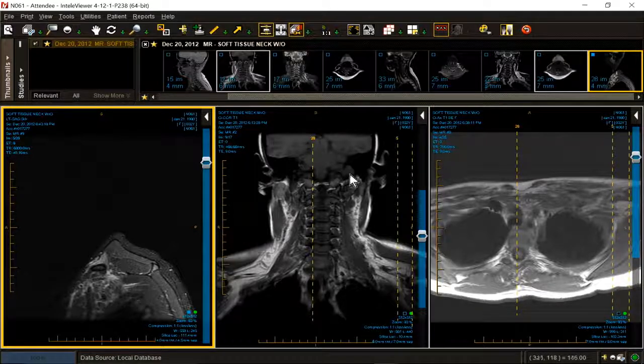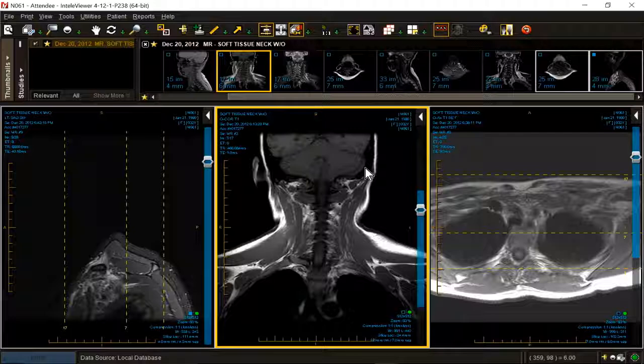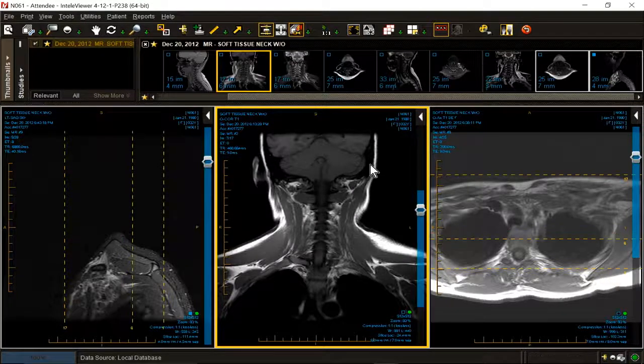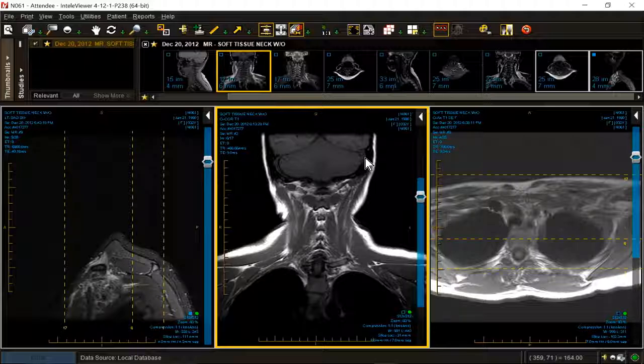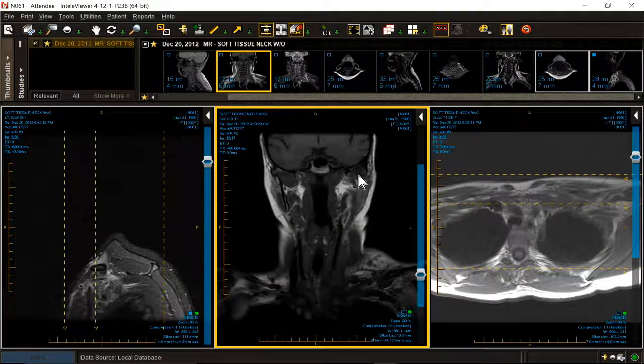Things are getting more ominous. It's big, it's fat, it's gray, it's smooth. It's not good. Let's keep going to the lateral sinus. Slow flow, in-plane slice entry phenomenon, white on T1, but not gray on T1, not smooth and gray, not almost solid looking. The lateral sinus is thrombosed. The sigmoid sinus is thrombosed. The transverse sinus is thrombosed. This is a life-threatening abnormality. Aggressive anticoagulation is necessary to save this pregnant woman's life.